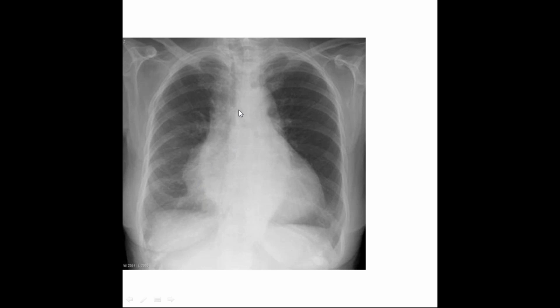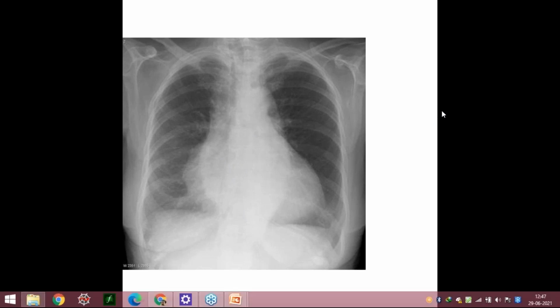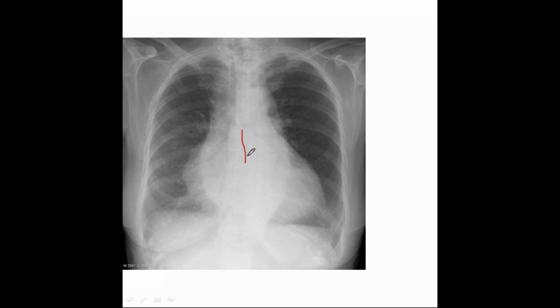Yeah. So if we see, the cardiothoracic ratio is increased, the cardiac dimensions are also disturbed. If you draw a line over here, this is definitely not 1/3. So this ratio is also increased. Tamponade, you cannot be sure, but it could be a DCMP.